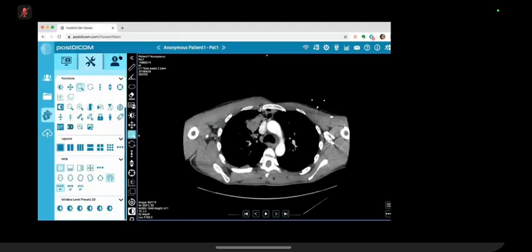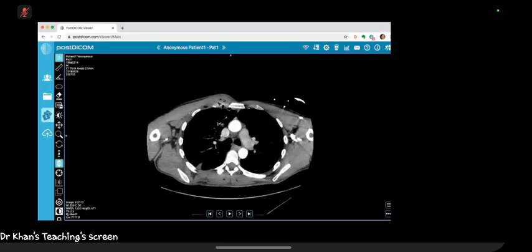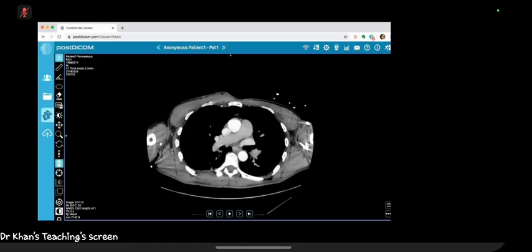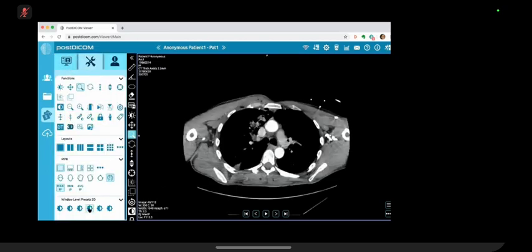The soft tissue window demonstrates the entry point of the stab, which is just to the right of the sternum, evidenced by air locules subcutaneously and also within the tissue just above the pleural space. And I think I saw some likely pulmonary hemorrhage within the lung as well. And there's associated hemothorax inferiorly and a small anterior pneumothorax as well.